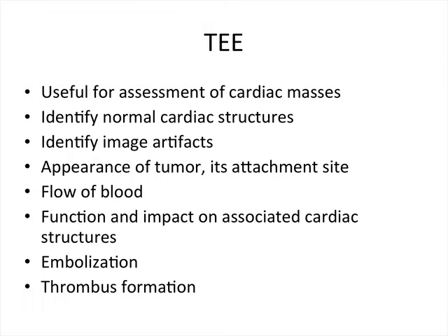TEE is a useful imaging modality in the assessment of cardiac masses. Its enhanced resolution and the ability to position the transducer close in proximity to the structure or cardiac mass of interest make it helpful in diagnosis, especially as compared to transthoracic echocardiography, in which it is often difficult to position the transducer close enough to most types of tumors or masses.